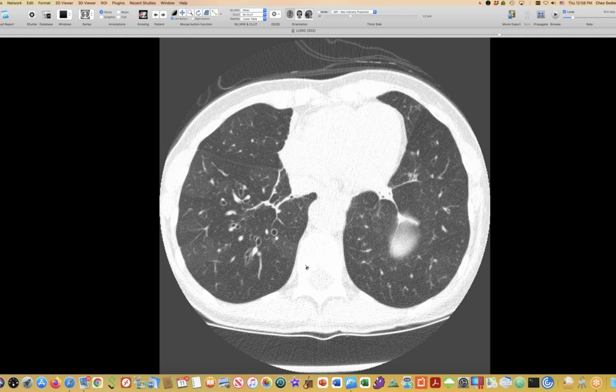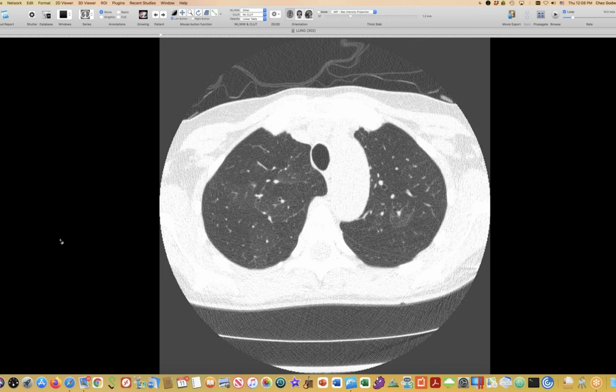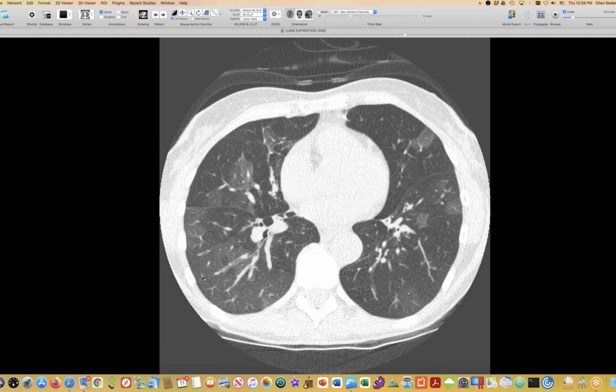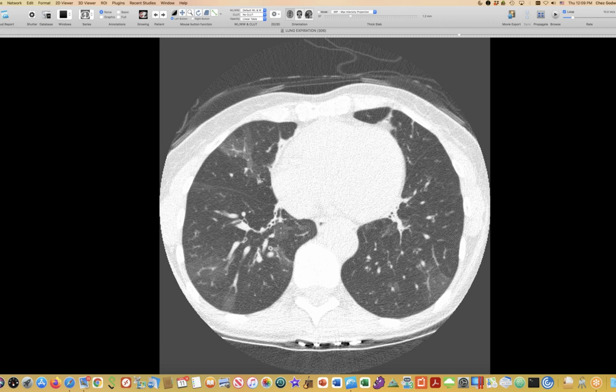And it does show that there's some mosaic attenuation. And here's our dilation. So the dilation and thickening of the wall of the bronchi is pretty generalized throughout both lungs. It's not focally worse, or accompanied by a lot of scarring that would suggest that there had been an infection, for instance, that set off this bronchial disease. And then the revealing thing is exhalation here, or expiration. You can see that she's got this profound degree of air trapping. She has more black lung, which is abnormal, trappy lung in this setting, than she has normal lung that can exhale and increase in density.